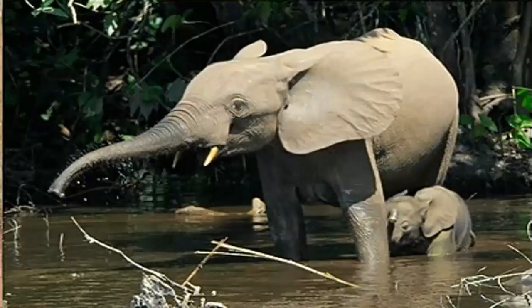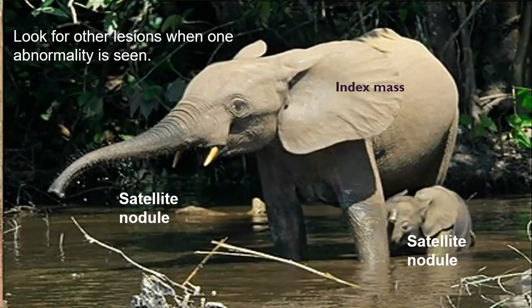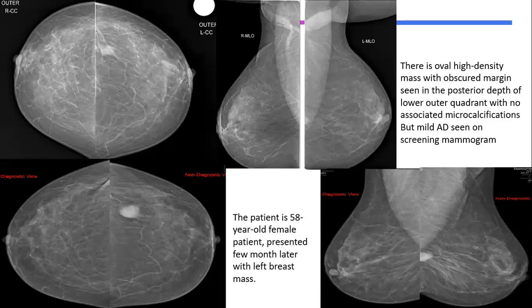So the message here is, if you have seen an elephant, look for a similar smaller elephant. If you have seen an elephant on mammography or any imaging, look for a smaller one in its vicinity. This is like an index mass and the satellite nodules, okay? And this lady also had a missed breast cancer.